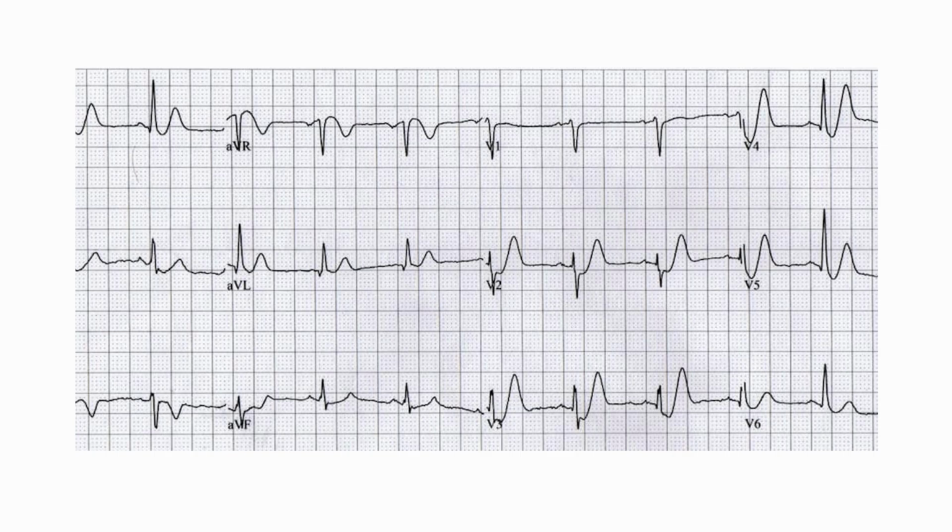Again, this is a very classical exam-oriented ECG, and I have come across a couple of patients in the last few years. This is De Winter's T waves, and this is equivalent to an anterior wall STEMI. The lesion over here is either in the left main or proximal LAD. So the patient goes to the cath lab and is treated accordingly.